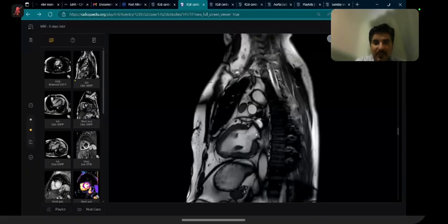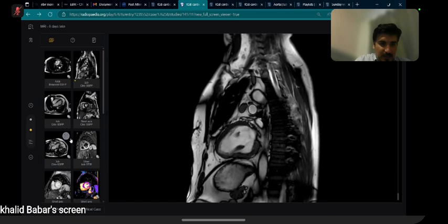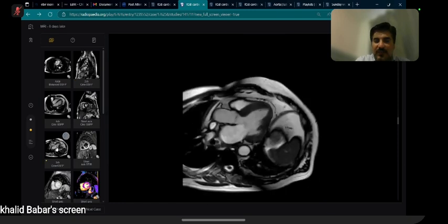Here you can see a small amount of jet there. So probably some regurgitation is there. And you can see the papillary muscles as well. So this confirms that this is the left ventricle. In right ventricle, you won't see these kind of papillary muscles. The left ventricle is also thick walled. You will see a moderator band in the right ventricle, which is used for identification of the right ventricle. So, yes, candidate number 2, what do you think?